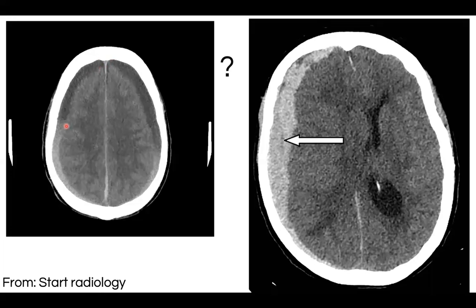So the acute component where there's active bleeding is this whiter area down here, which you can see on both sides. And the darker or hypodense area is the resolution of the blood, so the older bleed. Yeah, so they are bicrescentic lesions. Does it all make sense to everyone? And there's no midline shift here on the left.